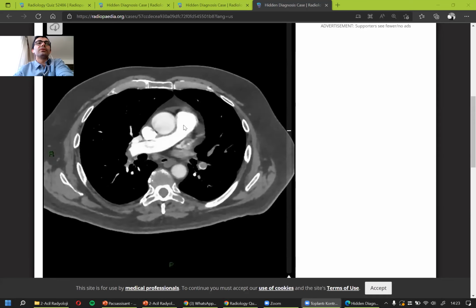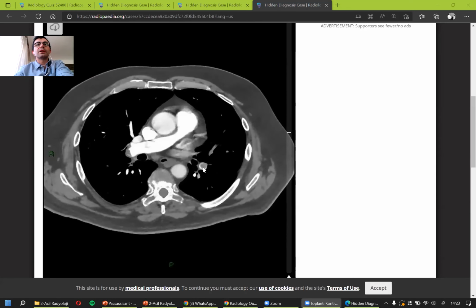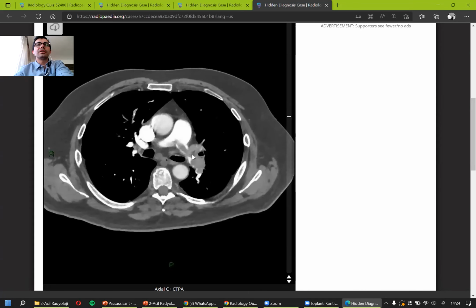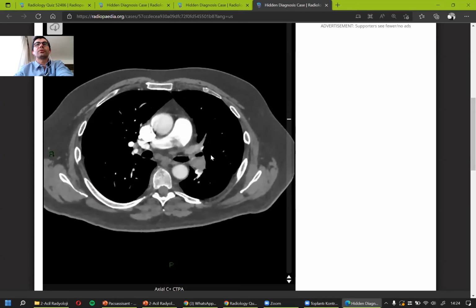All right. So if you look at this patient, thank you, doctor, for your good diagnosis. By the way, you have started from a very nice point. We are seeing a lot of thrombus starting from the main arteries, and many of the lower arteries are also occluded by the thrombi.